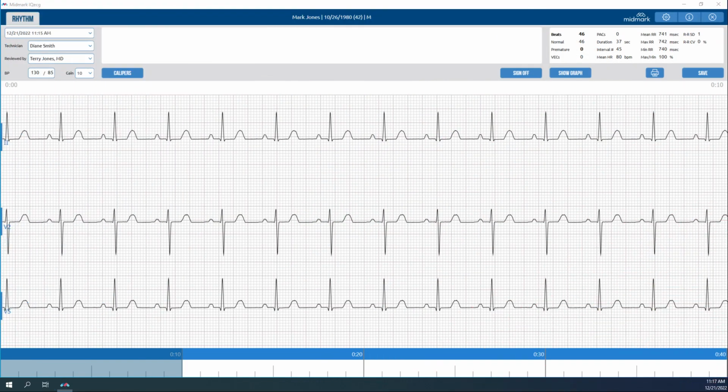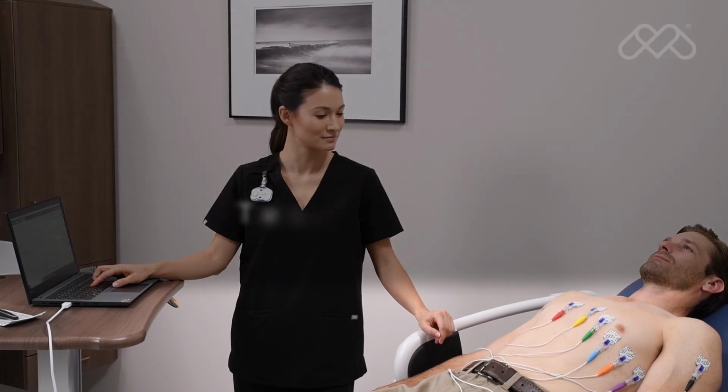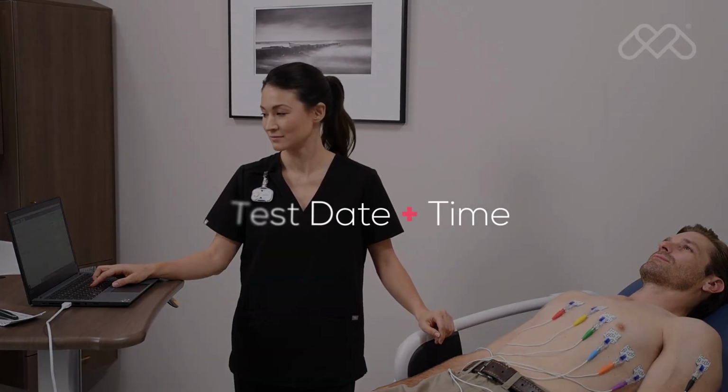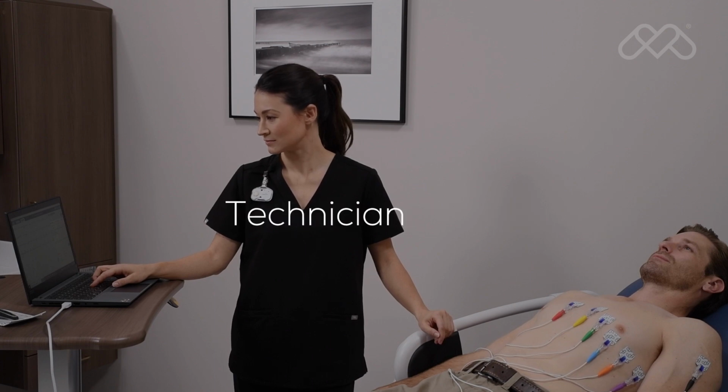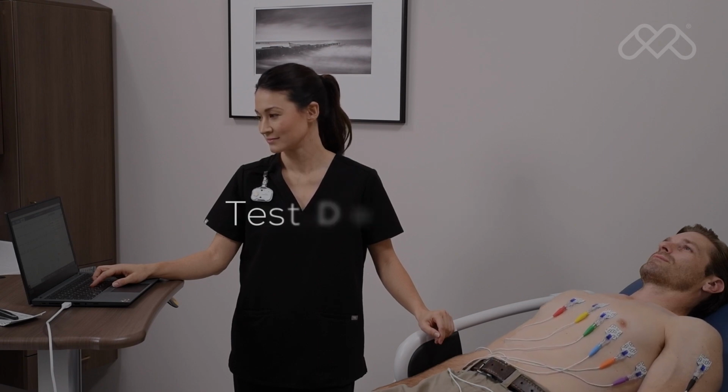Rhythm ECG. The rhythm review screen is displayed after the rhythm ECG test has ended and contains the following data: test date and time, technician, physician, blood pressure, and test data.